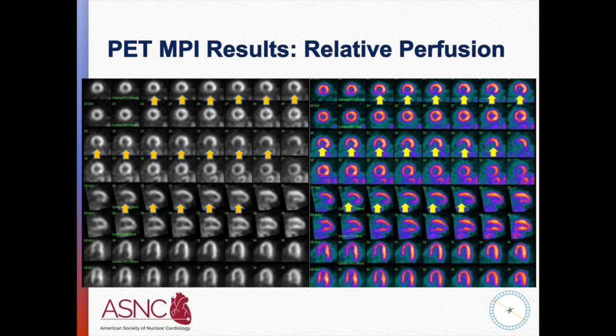You know, knowing that you are dealing with PET, with attenuation correction, with CT in this case, and not seeing any significant adjacent extracardiac activity, the only explanation for an inferior defect would be, in this case, ischemia in the inferior territories. Otherwise, the image quality is excellent. No other obvious sources of artifact that would affect our interpretation.